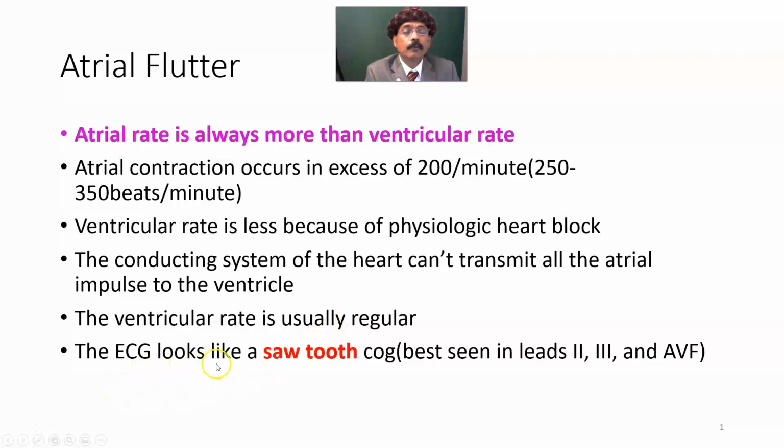The ECG looks like a sawtooth, best seen in leads 2, 3 and aVF. So we always look for a sawtooth appearance in the ECG tracings. Okay, that is a feature of atrial flutter.